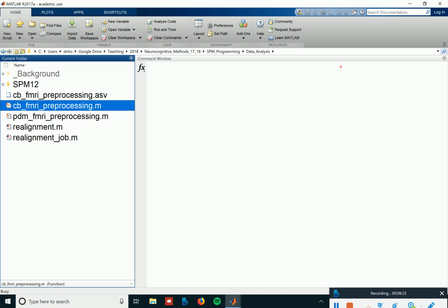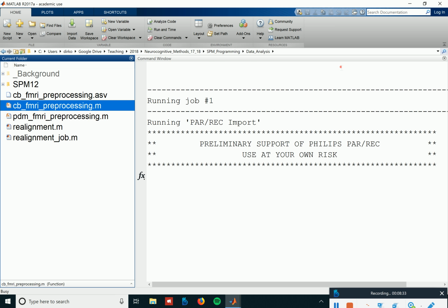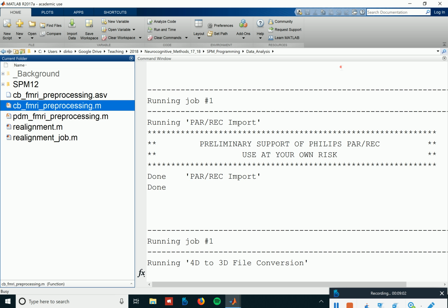Of course, you can also test this. I also recommend that if you test that, don't use the entire data. Start testing with like 10 files or so, especially if you do realignment and so on, because otherwise you always wait for a long time until, in this case, if you have 5 runs, 441 volumes, it's finished over all these roughly 2,500 files and so on. So start with 10 files and remove the rest or something, so that you don't wait but program all the time.